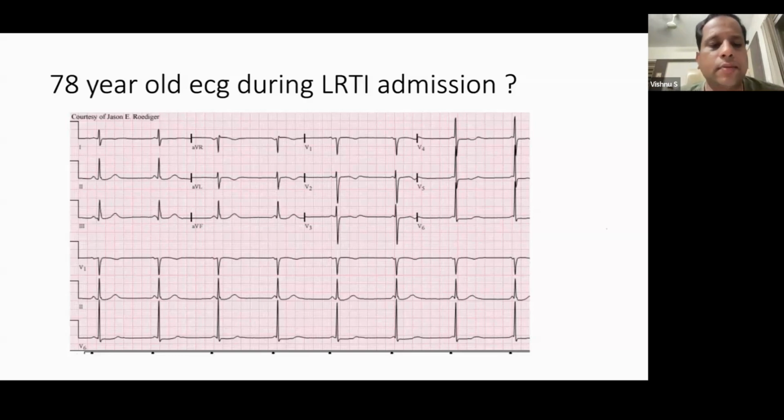You can see, sometimes we will see this in the wards also, but we will be unable to identify it. Does it indicate anything? Can anyone tell? In this ECG, if you see lead 2, this P wave, this PR is so short. This P is marching into the QRS like that.